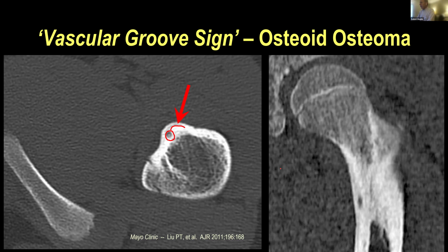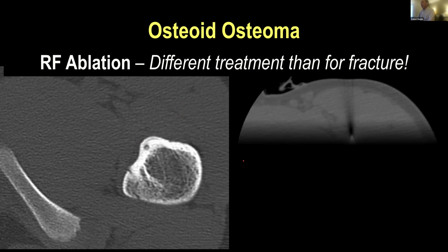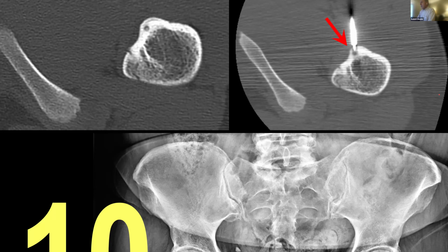So just in the differential diagnostic universe, we do think about osteoid osteoma in the appropriate setting, because obviously the treatment, the management is much different than for a fracture. This patient went on to be treated with a radiofrequency ablation.